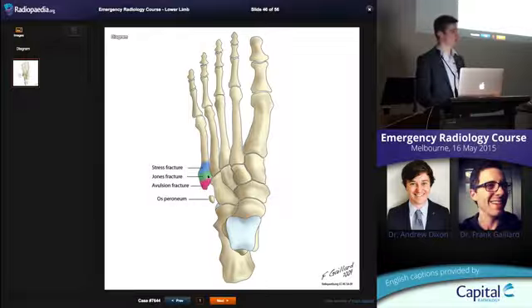If it's a little bit further along than that, then we call that a Jones fracture. Okay, you'll see an example in a second. If it's a little bit further along than that, then it's often a stress fracture, but you want to see other secondary signs to suggest that there's been stress there in the past. Okay, so worth knowing the different kind of spots. Os peroneum is a little bit of bone here that's worth knowing about. There's also another little ossicle, I've forgotten its name, that sits here, vesalianum or something. Worth knowing about those because people can confuse those as fractures. Again, corticated margin equals an ossicle or an old injury, not acute.